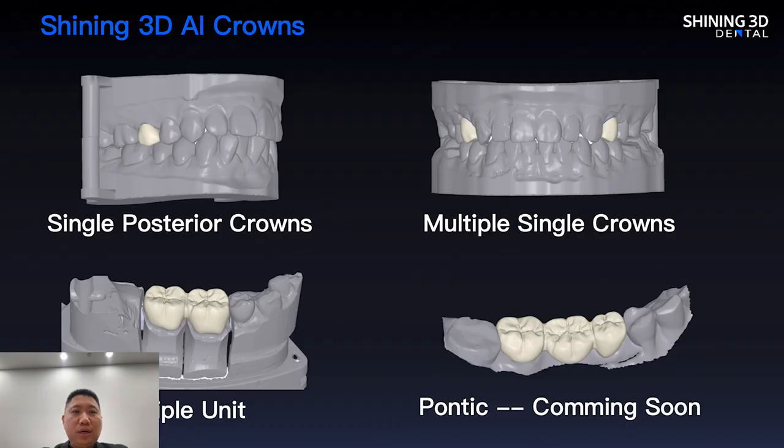For the AI crowns, we can use AI to generate single posterior crowns, multiple single crowns, and also multiple units with the connectors. Currently, we are also working hard on the pontics. I think it will be coming soon.